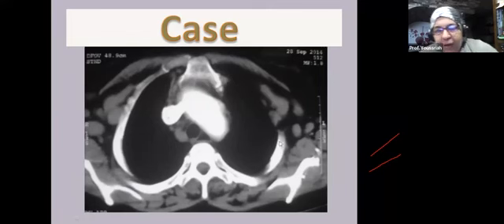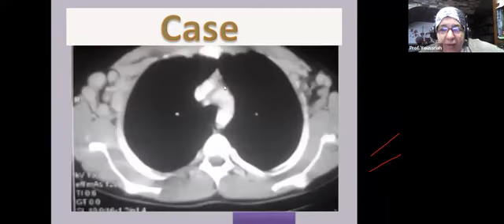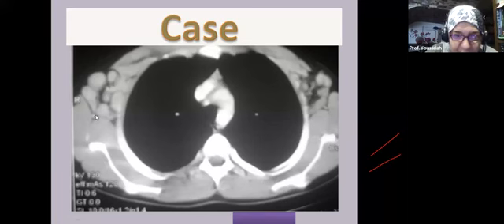We have here bilateral axillary lymph nodes. As you can see, this is a CT study with contrast, but the lymph nodes are not enhancing and they have the same density as, or even hypodense actually, they're like the muscles. In this case, however, again CT with contrast, we see that the axillary lymph nodes bilaterally show enhancement compared to the muscles, and we see tiny vessels in the vicinity of the lymph nodes bilaterally. This is pathognomonic of Castleman disease.